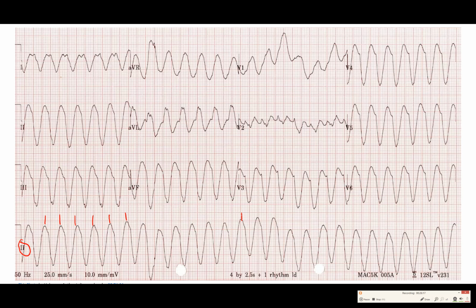But what's different from this and the atrial flutter we saw that was also 150? Remember, the atrial flutter actually looked like a regular ECG. You had T waves, you had QRS complexes, you thought something that could have been a P wave, right? This one has just very wide QRS complexes. That's it. These squiggles are wide QRS complexes. So when you have a fast, wide, regular tachycardia, you know that this is what we call ventricular tachycardia. And my pen is not wanting to write right now. Ventricular.